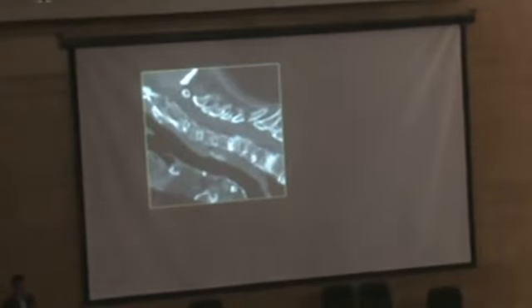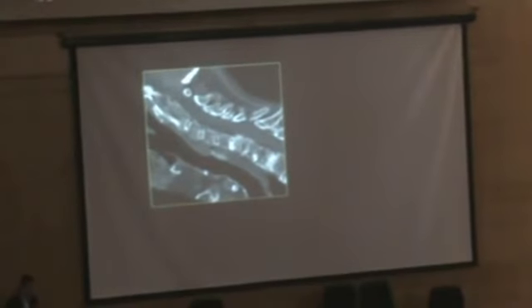And this is an example to show you again. This is a rigid spine, but it's a very fragile spine. It's really fragile. Huge osteopenia. This is a subject with ankylosing spondylitis. You can see here already something going on in the posterior element, probably a transdiscal fracture, and this subject was going to be intubated for emergency purposes.